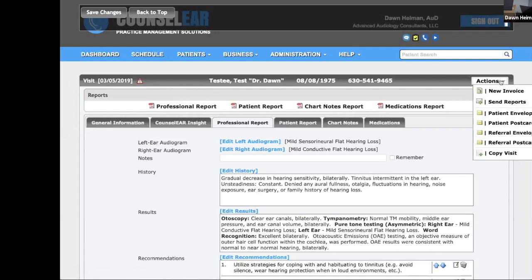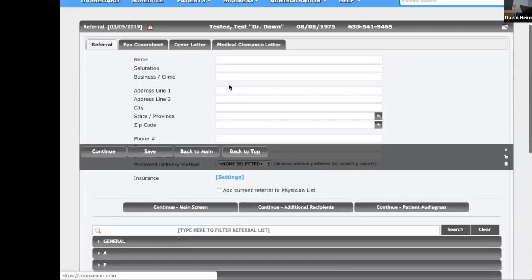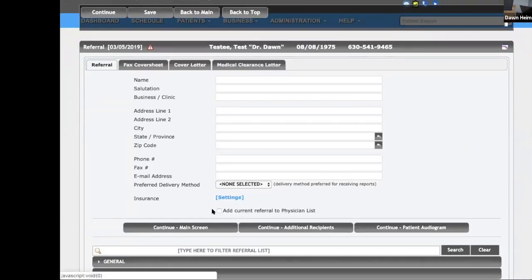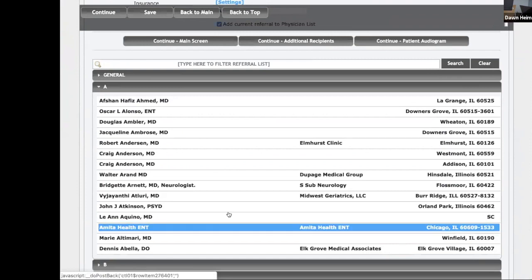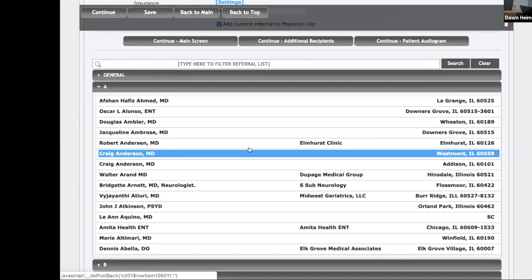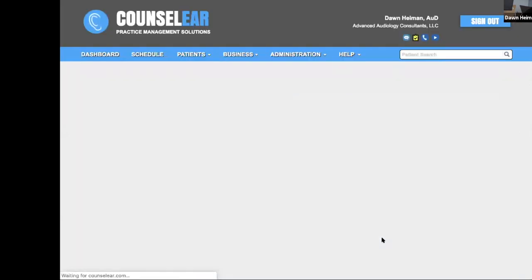If I know everything's good, I can go to actions. Oh, wait, hold on. Who's my referring doctor? Let's say you have a new doctor, you put it in, and then make sure that you add them to the list, and the category might be under A, let's say. So that later on it's Dr. Alvarez, let's say, and you find A for Alvarez, right? I'm not gonna really do this, but Dr. Ahmed, let's say, okay? Let's say Dr. Ahmed is the referring physician.